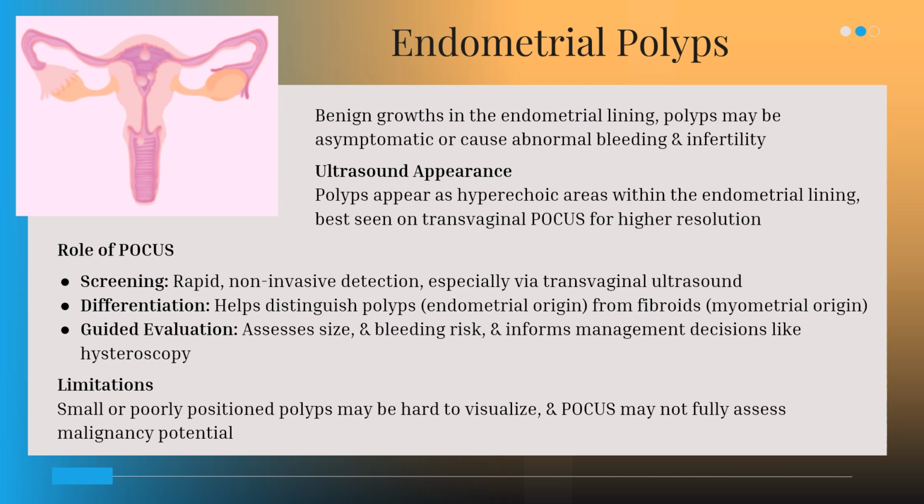You can differentiate between polyps and the fibroids based on the location, and do some further evaluation of the size, the bleeding risk, the management decision. If there's significant polyps present, the obstetrician may be talking to them about a hysteroscopy to do further evaluation. So there are challenges with ultrasounds because if they're small, poorly positioned, hard to visualize, you may not be able to fully assess how significant these polyps are.